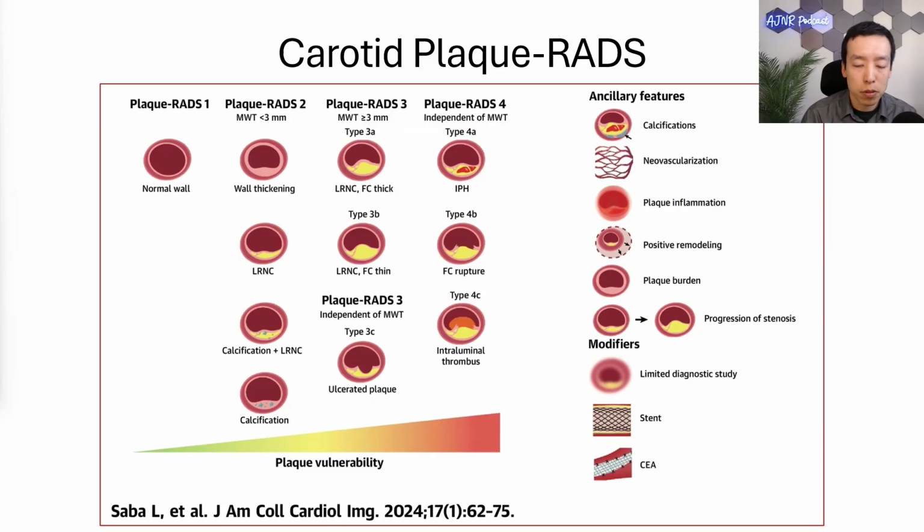We're all very familiar with making the NASCET-style stenosis measurements, but it turns out this grading does not capture all the stroke risk in patients who end up having a large artery-to-artery embolic stroke. So the stroke imaging community has had increasing interest in looking at plaque composition and surface disruption markers as well. Plaque-RADS tries to standardize that into a rating system.